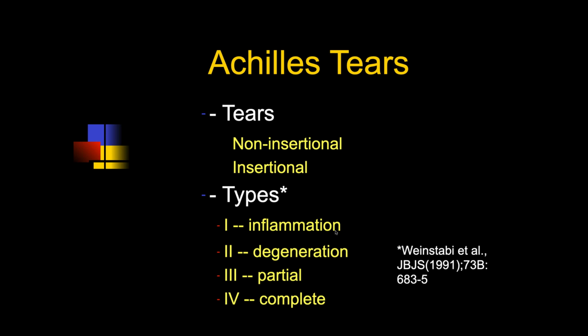It's kind of old. I think it's better to look at these different stages as being early tendinosis or grade 1 partial tears like we see in other tendons. Grade 2, you get much more extensive increased signal intensity within the tendon, degenerative change. Then you can see partial tears and then a complete tear. I read that journal many, many times, John, and I never used this. Yeah, good.